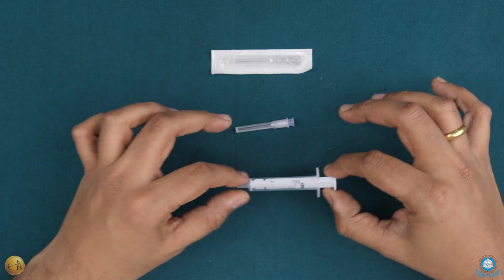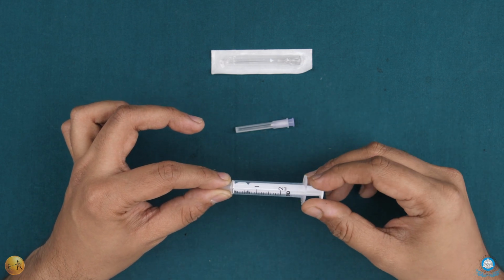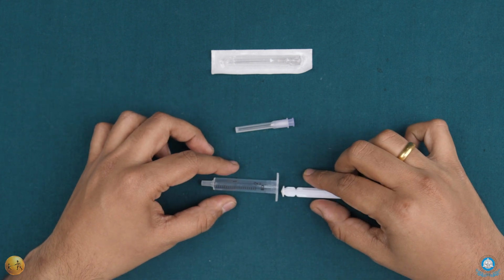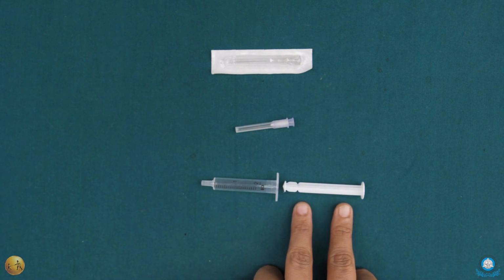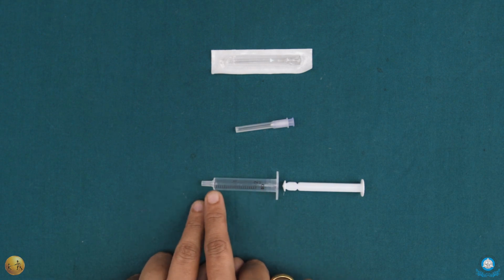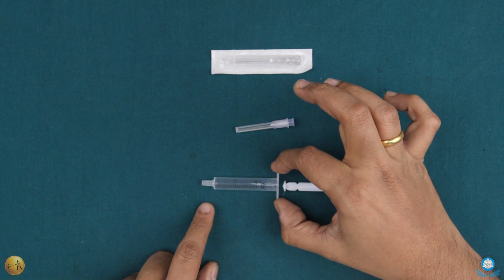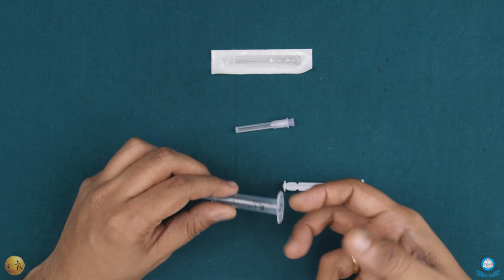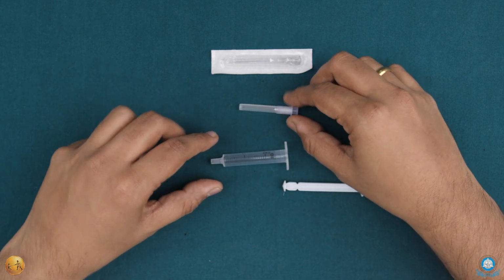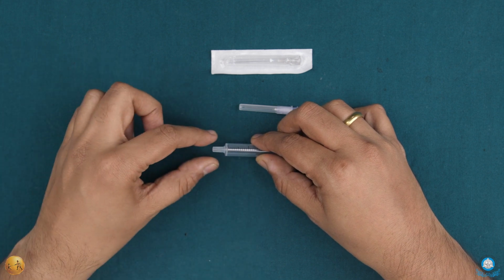Now let's first talk about the syringe itself. This is a 2 ml syringe, like you can clearly see from the graduations. Now let me just disassemble the syringe itself. Now the white plastic part that you see is called the plunger, and then you have the barrel. Within the barrel you see the graduations, the ml markings, and other than that you notice these plastic outcroppings. They are called the finger flanges, where your finger rests when you are actually injecting, and then you have the needle adapter. This is the part of the syringe that accepts the needle.